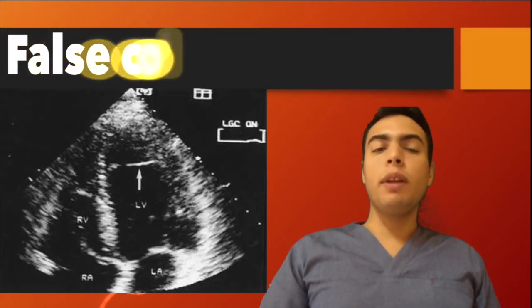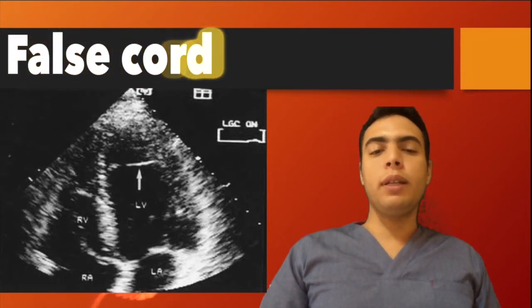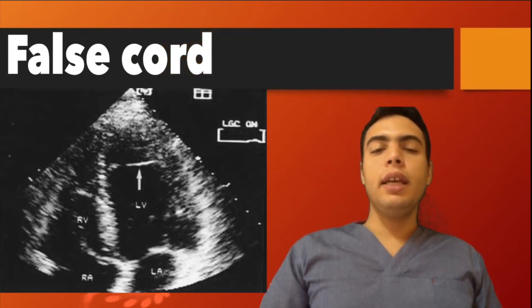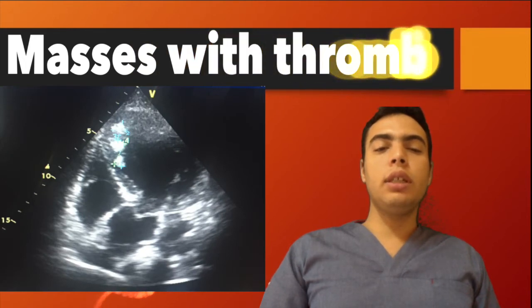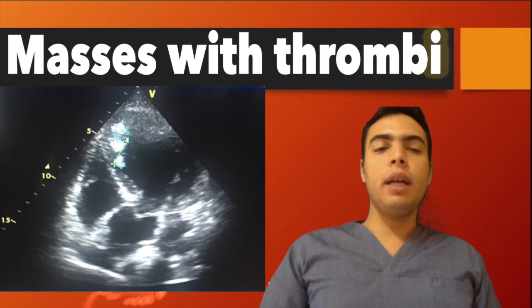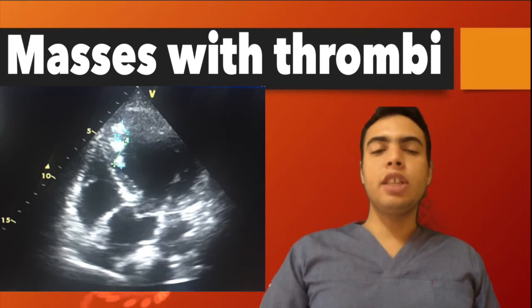Let's talk about some normal findings that you may consider abnormal in the left ventricle. Here, as you can see, there is something called the false chord, which I signed here. It looks like actually the moderator band, which we will see later on in the right ventricle. Here, as you can see, a case which I recorded, it contains multiple masses, as you see here, in the ventricle with thrombi, which means it can send a shower of emboli. Here is the thrombi in the left ventricle.